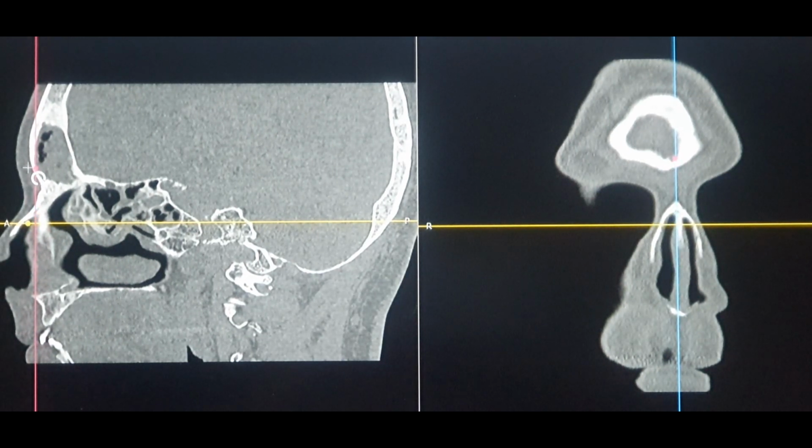So if we start from the frontal sinus, that is the frontal sinus, which you can see on the sagittal scan and on the coronal section. It's full of opacification with a lot of anaerobic gas shadows over here, which suggests that this patient was having a secondary bacterial infection within the sinus along with a collection in it. So that's the anterior table of the frontal sinus, which is made up of definitely the frontal bone, which you can see over here.